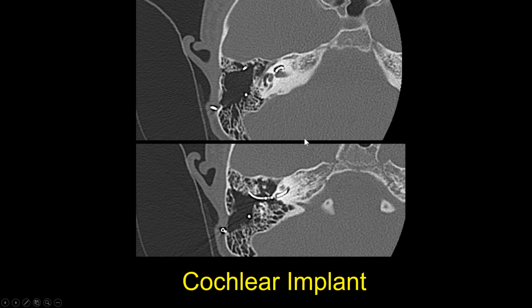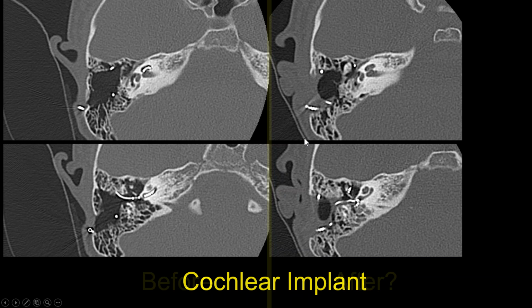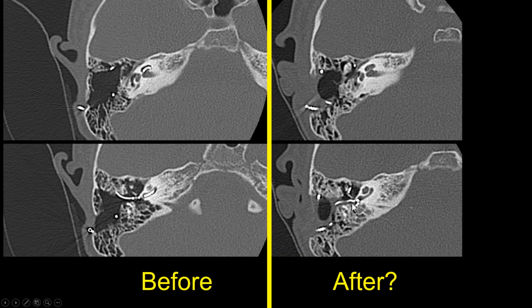Now, in this particular case, the patient came back years later, and the cochlear implant was no longer working. So this is a case where we actually have retraction of those leads. Previously, on the old postoperative study, we saw the leads within the basal turn of the cochlea, and now they've been retracted.